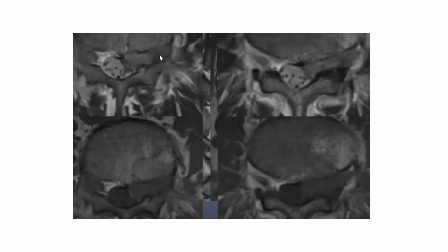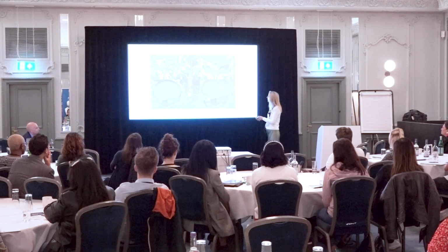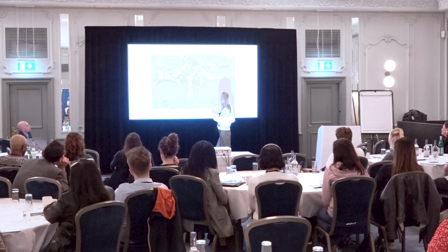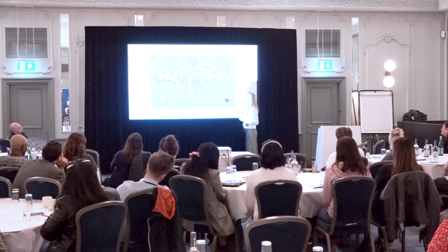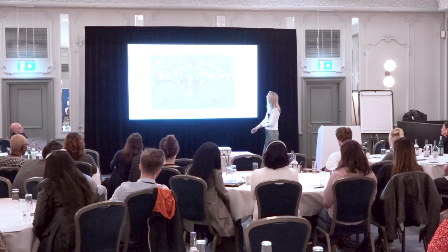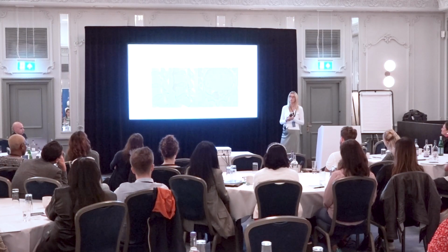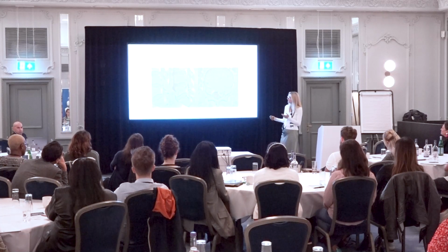Because usually when patients get referred with neurofibromas, they're about 95% they're discs. But you can see it's broad-based. It follows the tract of the foramen, and you can see it was very reasonable to think of this as a schwannoma. So we brought the patient back to give contrast, and you can see there's this peripheral enhancement. And this turned out to be a disc. Now, sometimes the schwannomas can be necrotic, so sometimes it's difficult to tell between the two, but it's just a common thing that we get in our MDTs.